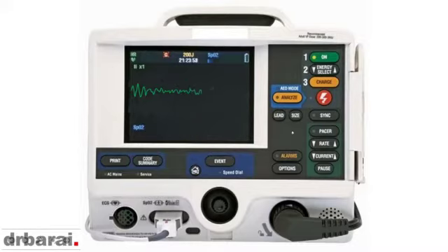Now this is the defibrillator machine which can be used both in AED mode, automated mode, or manual. So this is the on button. This is how the electricity is charged or selected. For example, here there is 200 joule. You can either decrease it or increase it. We start with 200 joule in an adult patient. This is the charge button. This is the delivery of the shock. Synchronize button. Pacemaker: if we want to do pacing, that is the button we need to press.